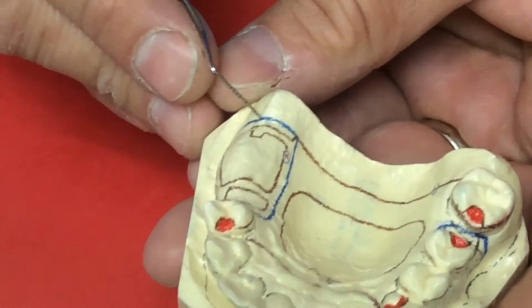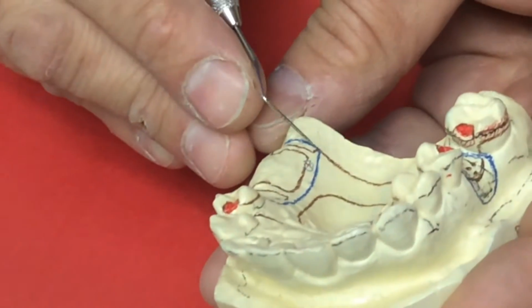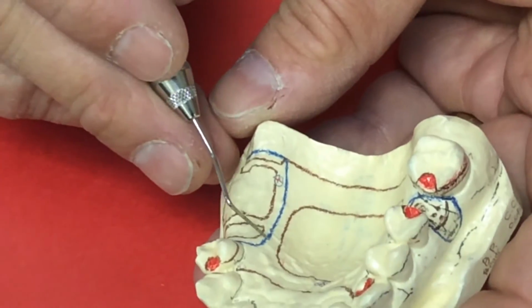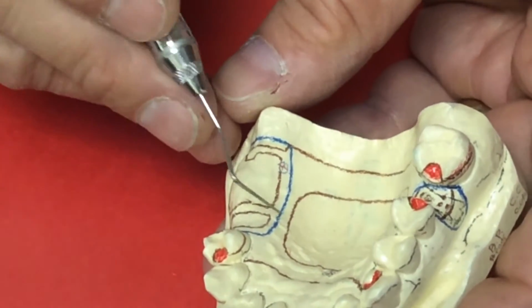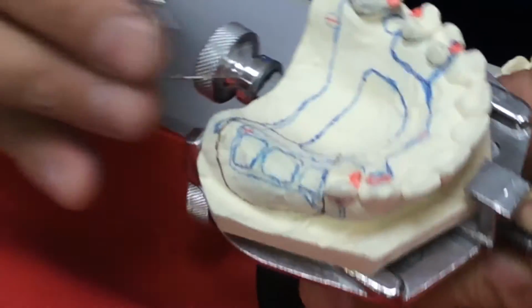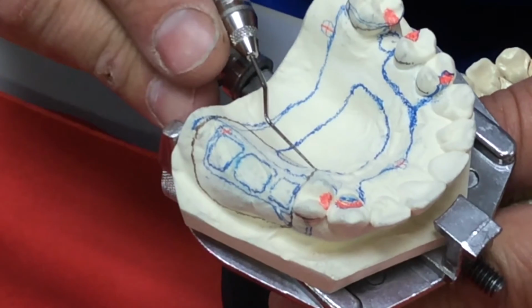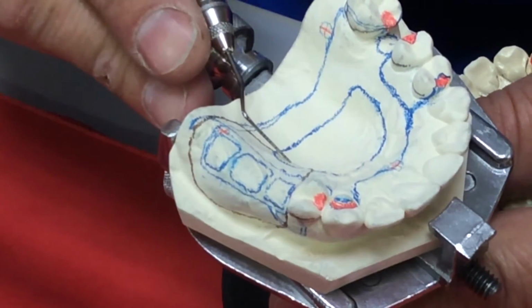You want your acrylic, however, to go all the way back to the hamular notch. You're going to come around and make sure that you're indicating your acrylic just below the open lattice. Some of you, and let me not point anyone out, but let me just grab this one for a second. This is incorrectly drawn. The acrylic is coming down and into the opening of the AP strap.